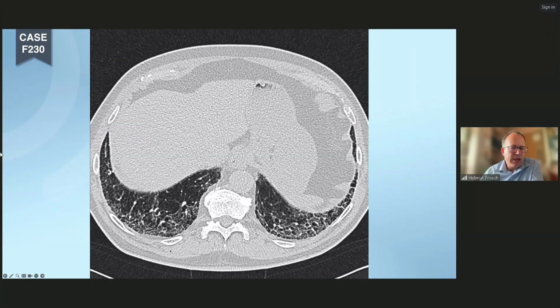You must see that in a way, whenever I see as a radiologist changes which look like a tumor, we call it tumor until proven otherwise, because that would be the worst situation, which would require a swift diagnosis. And that's what we do here. We say probable UIP, meaning you need to diagnose or exclude IPF.